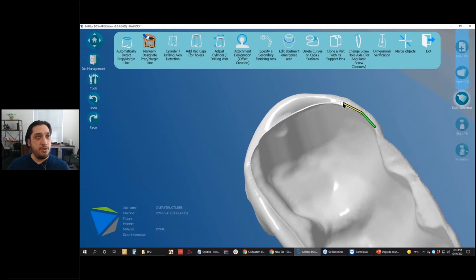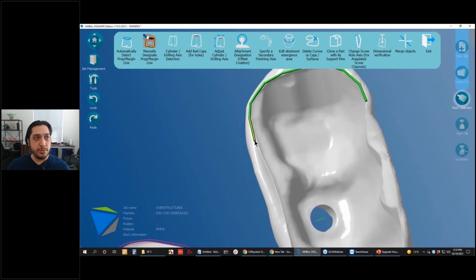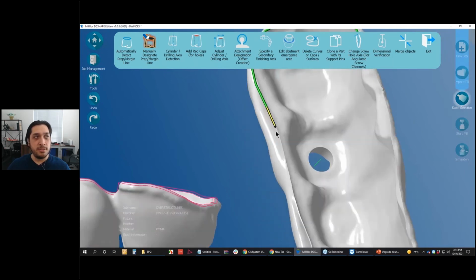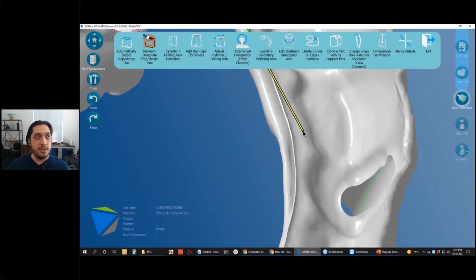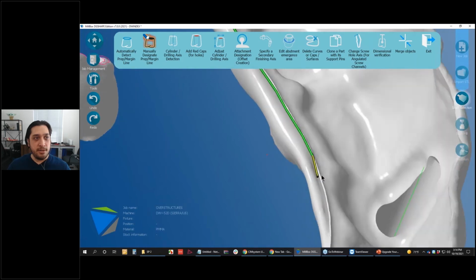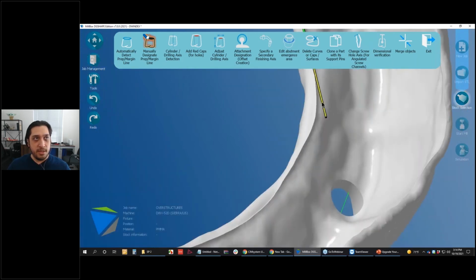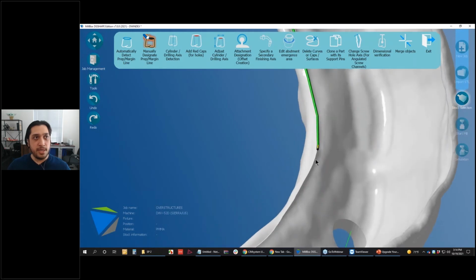But if you do control your own files, you control how the CAD is outputting your files, then generally speaking, you should have a rule in place as far as your internal production. If it's 3Shape, you need to have that PTS file that goes along with the STL. If it is exocad, you need to always make sure to have that construction info file to go along with this. So what I'm doing now is kind of doing almost a little bit like connect the dots here. Basically, I'm moving my view along to kind of progress this curve.